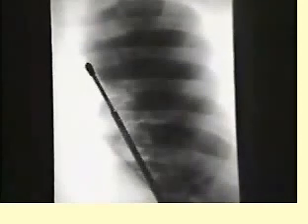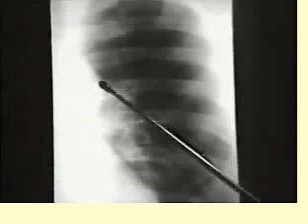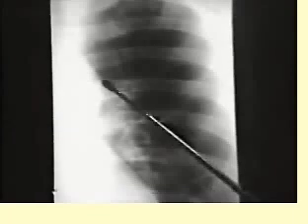You can see the aortic arch here. You can see the left pulmonary artery coming up, but you can't see the top of the left pulmonary artery because there is this mass shadow encroaching on it and obliterating it, and this is the mass that we were seeing in our transverse scan through the AP window and along the aortic arch in this region.